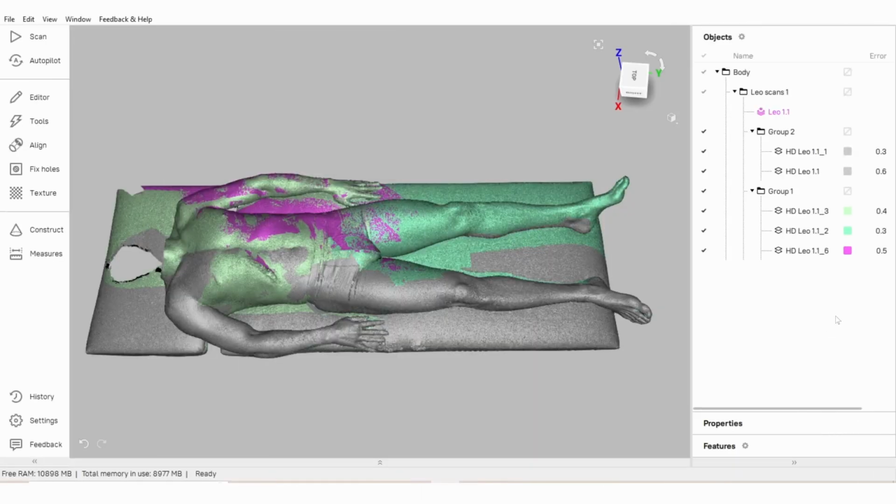Following HD reconstruction, we can see the scans in the workspace and 3D view window. If a scan is continued for several sessions, it will appear as a group in Artec Studio. Each time the Add Scan function is used on Leo, a new scan group will be formed. Scans need to be processed in order to build a model in Artec Studio. But before we start working with the data, it makes sense to check whether the scans are good or you need to rescan your object.